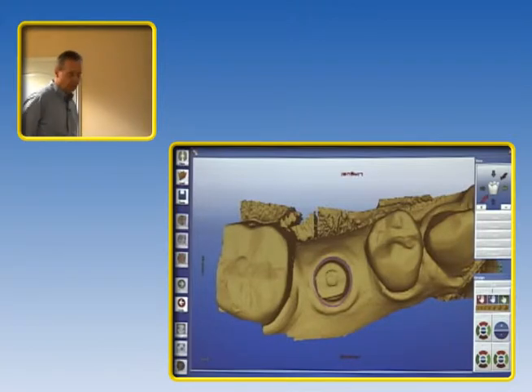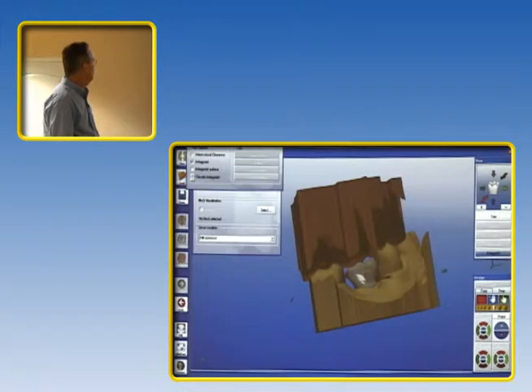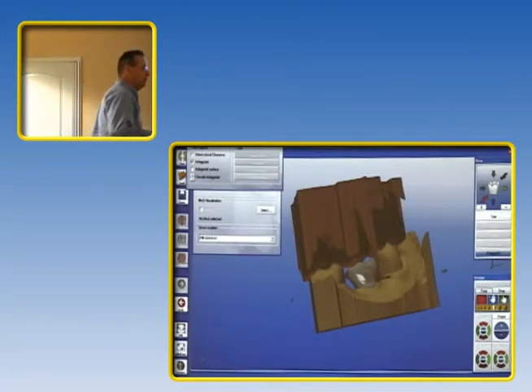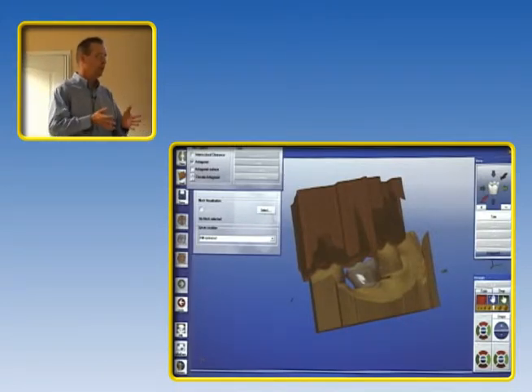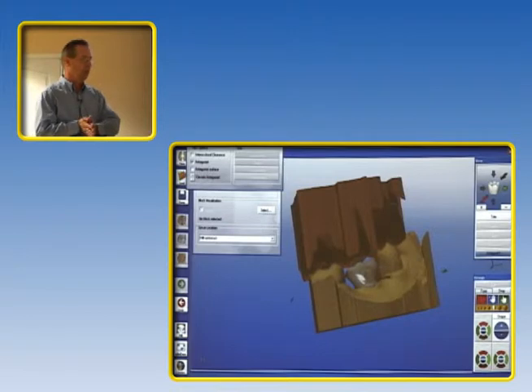So now here I've gone forward and I've started working on the case. And this is one of the things that we've talked about too, is that hopefully going forward we're going to be able to cut down our turnaround times on this. Because if you upload the case, I should be able to start working on it right away. I don't have to have that model yet for it.